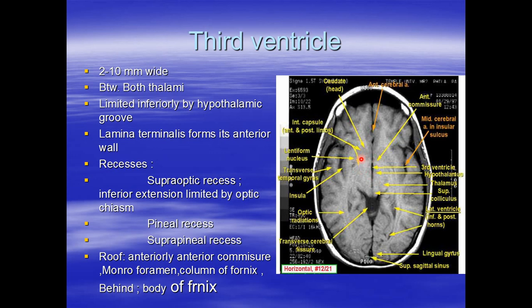It has recesses: the supraoptic recess and the infundibular recess, the pineal recess and the suprapineal recess. The supraoptic recess extends inferiorly till the level of the optic chiasm.